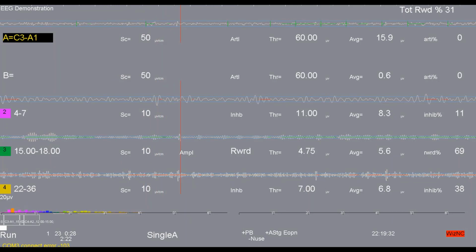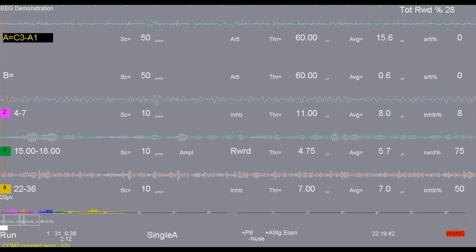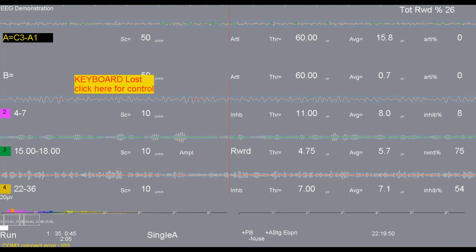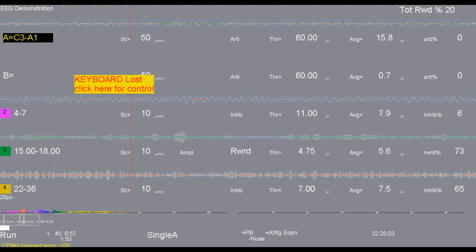That's really it. So you can have a look at the EEGer games that are available there on the website. You can download them and you can install them. Then you do the game initialization tool, and then you can see what they're like in replay mode. And ones that you feel are good, that you like, you can go ahead and actually purchase a license for them. Others that you don't like, you can either just leave them there, let them sit there, or you can uninstall them. And you go about uninstalling games the same way you would uninstall any program. Through Windows, you find the uninstall tool and you search for that particular game.